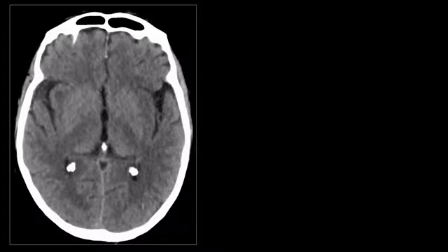So this is the disappearing basal ganglia sign, and a bit similar is the loss of the insular ribbon sign. The insula is also supplied by penetrating insular arteries. These arteries supply a region that is probably the farthest removed from collaterals of the anterior and the posterior cerebral arteries, making this region also quite vulnerable to early ischemic changes in the case of a middle cerebral artery stroke.